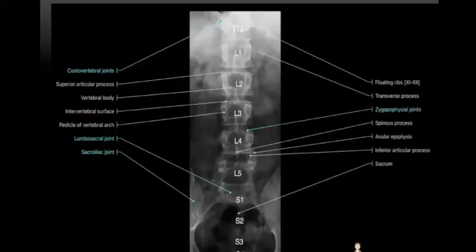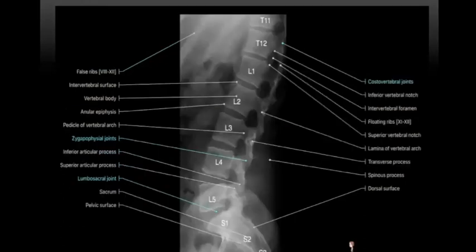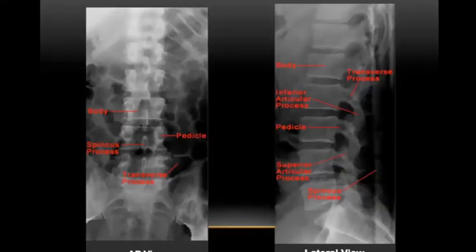Okay, these are the radiographs on lumbar spine, on AP and lateral view. Okay, these radiographs are only showing you the normal anatomy. So the body, inferior articular process, superior articular process. Okay, so inferior, superior, and transverse process on the side. Kalau tengok on lateral view, transverse process on the side, pedicle, lamina, and also the spinous process at the back here.